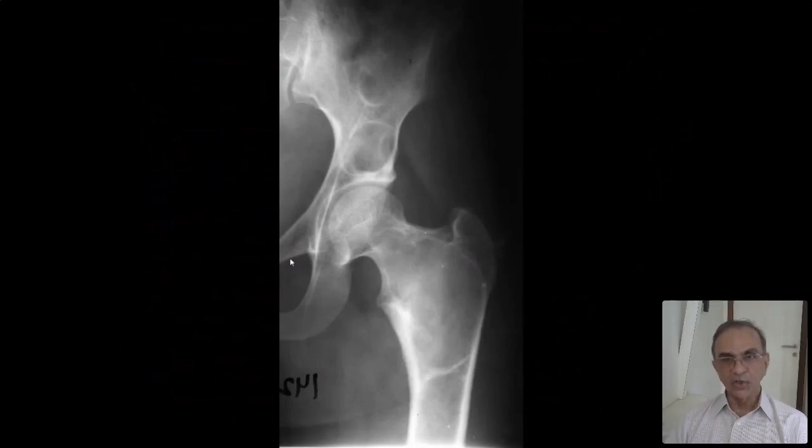This is another non-tubulation of bone. You have ground glass opacity, which is classical fibrous dysplasia. This is the same as the previous one. This is a localized view.